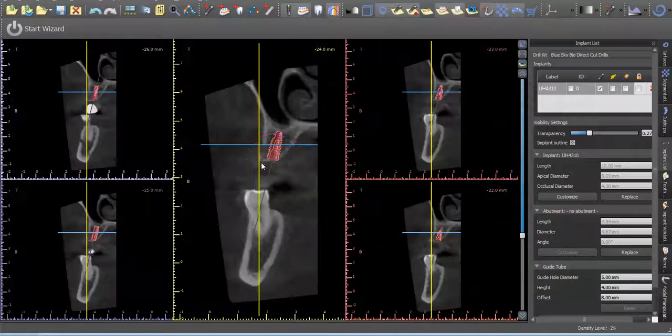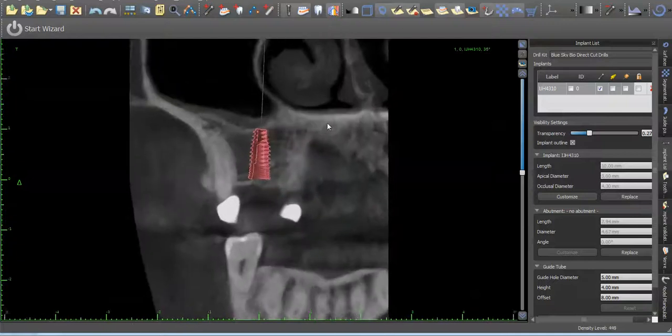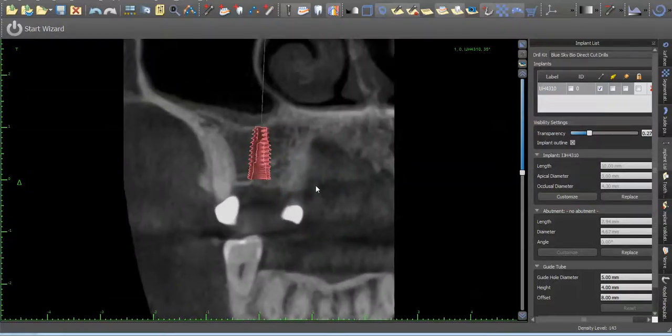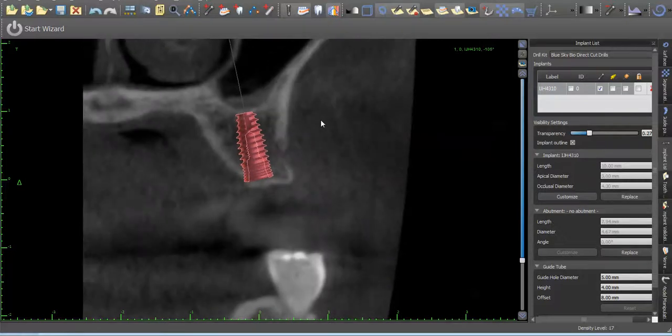and then going back into this image, making sure that looks good. Finally, I really like to look at this image and scroll through. This is taking your right button and clicking it forward to zoom in and just scrolling through this image to make sure this looks ideal.